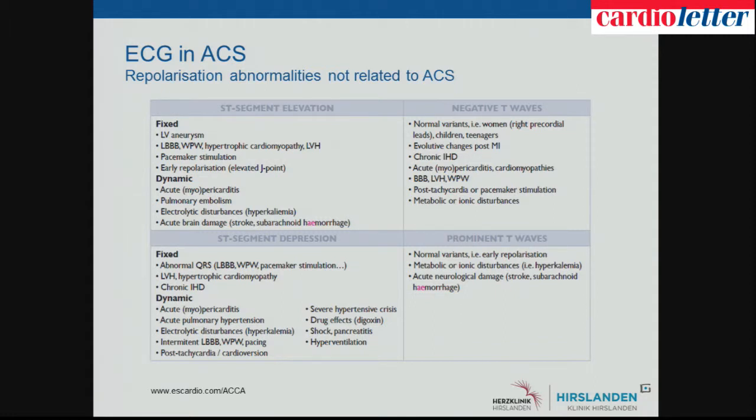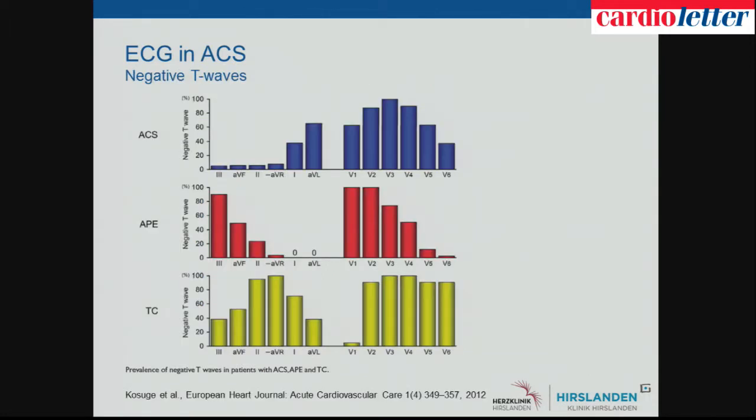Let's have a deeper look at these typical signs. Negative T waves: it's not specific for ACS, but what is nowadays well known is that we have distinct patterns of T wave inversions depending on the clinical condition.